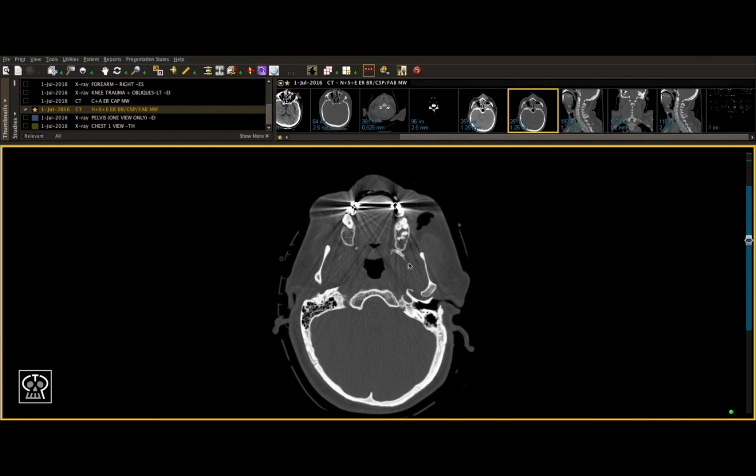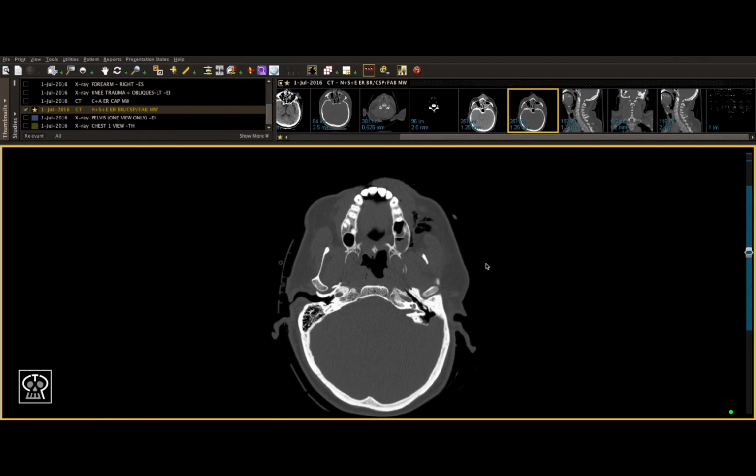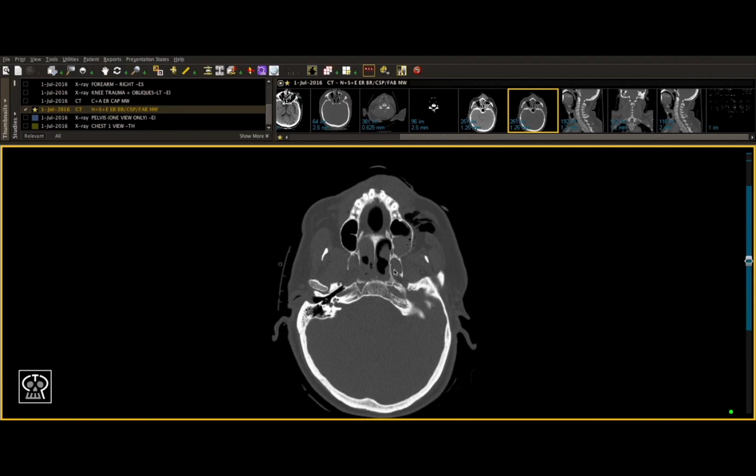As we're scrolling through, there seems to be a discontinuity in the lateral left pterygoid plate. And indeed, in one area, we seem to see two of them next to each other. This indicates an overlap, or that one area was fractured and displaced. In addition, when it comes to the medial plate, although it is very subtle, there seems to be a break in the continuity here. However, I cannot be sure that that's a fracture at this point.